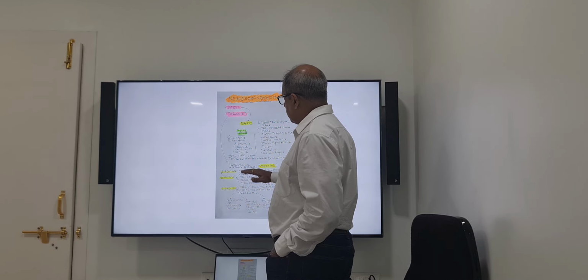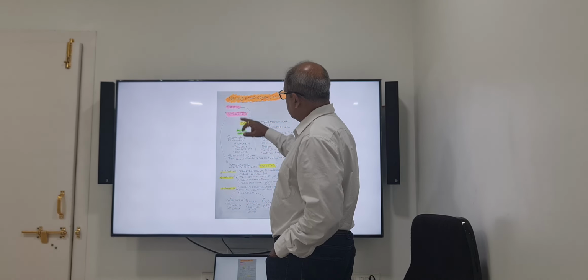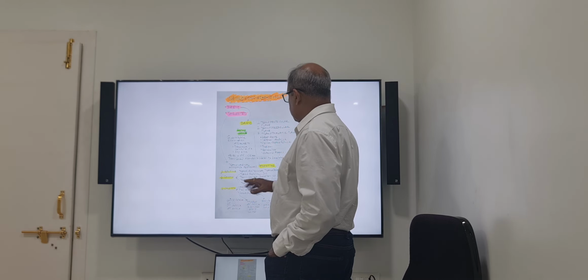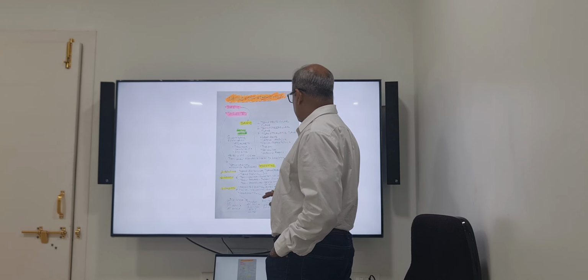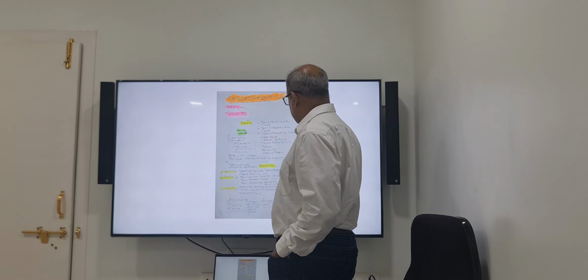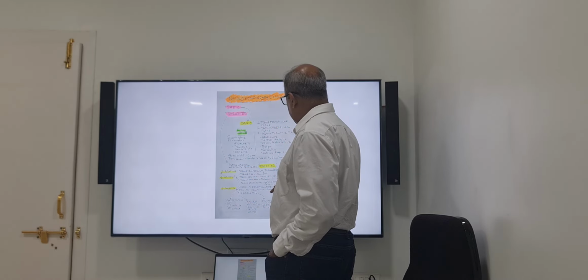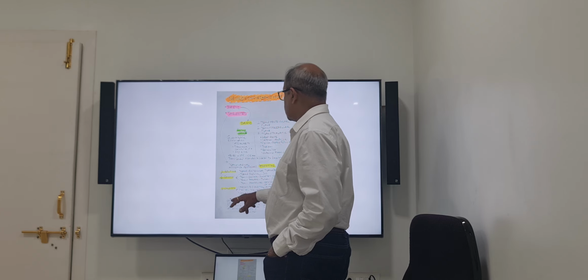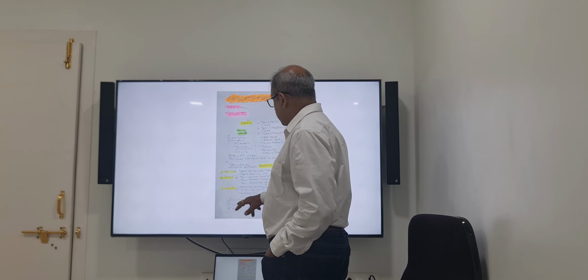This is the coronal sections. What are the sagittal sections in targeted neurosonography? One is absolutely median sagittal, but median sagittal taken as an anterior plane in the anterior part, median sagittal in posterior plane, and parasagittal. So when we do median, mid sagittal, anterior plane, we focus upon corpus callosum, cavum septum pellucidum, third ventricle and fourth ventricle.